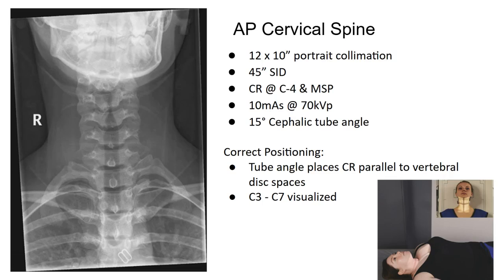I like the collimation side to side. The patient is nice and straight. We've included a right marker. I think the one thing we could do better here is notice how this mandible is overlying part of C3.